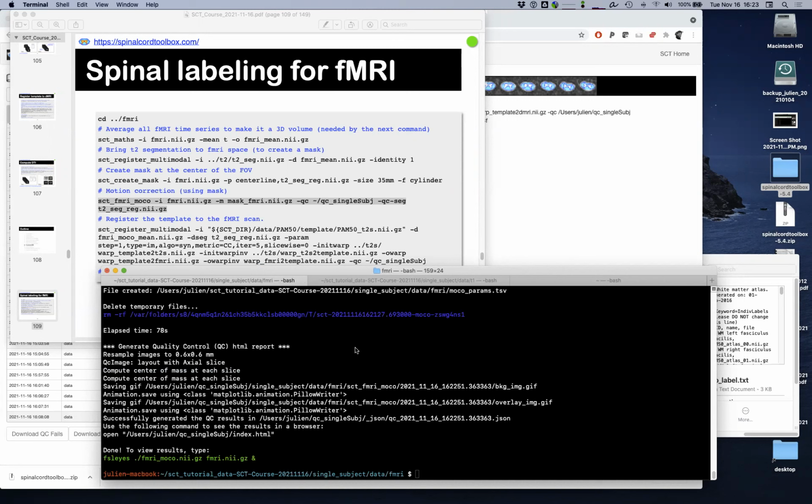You can always align them manually as a first approximation, and then select the smallest cylinder. The smaller the better, but the problem is that if you have a time series of 500 volumes and excessive motion at volume number 385, you don't want to miss it.